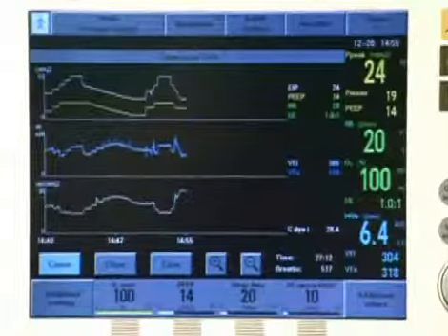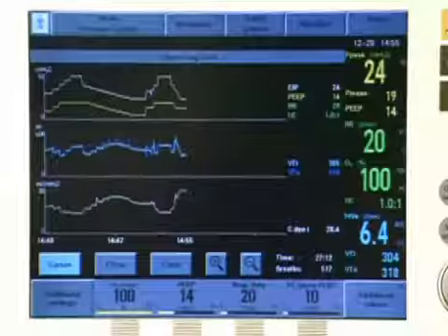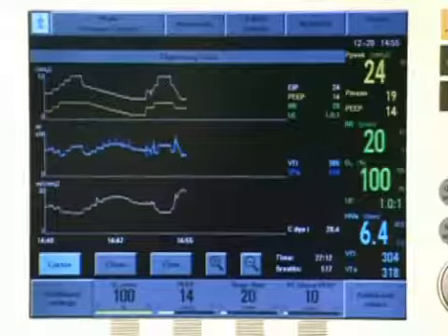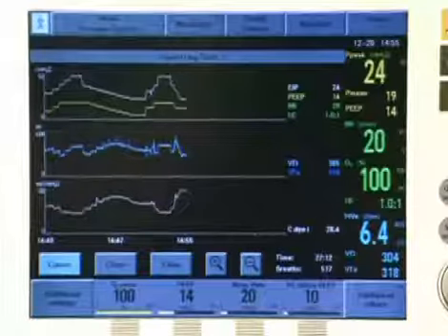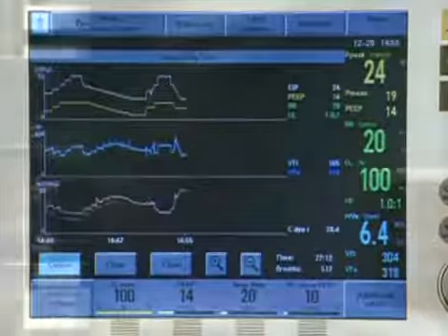This was improved to an end inspiratory pressure of 24 centimeters of water, a pressure gradient of 10 centimeters of water that resulted in the same tidal volume of 10 milliliters per kilogram, a PEEP level of 14 centimeters of water, and a dynamic compliance of 28 milliliters per centimeter of water after the recruitment sequence. The improvement in compliance will help to diminish the mechanical stress of the lung. When added to the avoidance of end expiratory collapse, the two most important goals of a lung protective ventilation strategy are met.